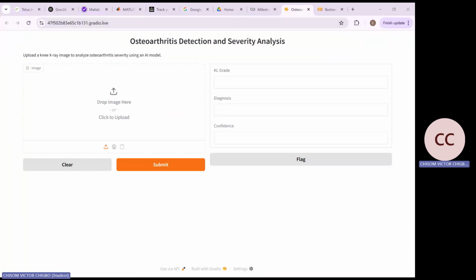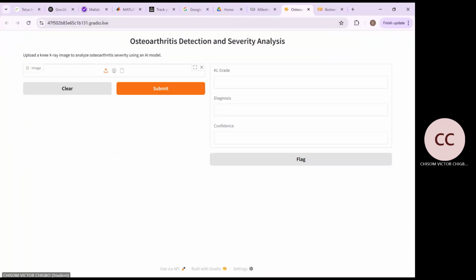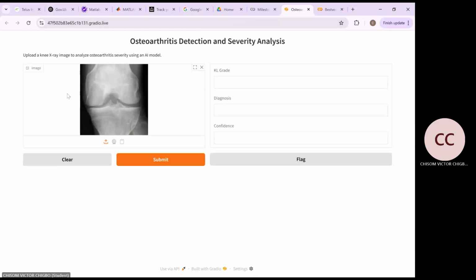They were just left for the testing phase, not all of them. So it's basically filled with pictures that the model has not seen. We could choose from anyone's severity, but I like the middle guy. So we choose one of the pictures in the mid. Yeah, so you can have a preview of the picture you're looking at.